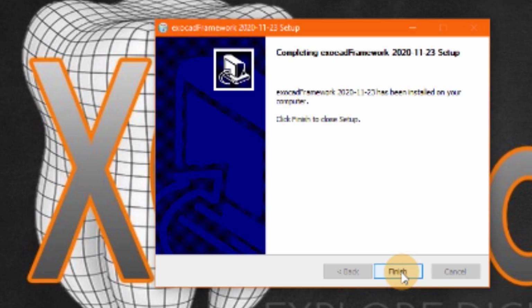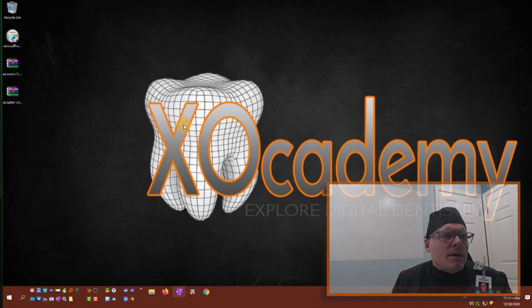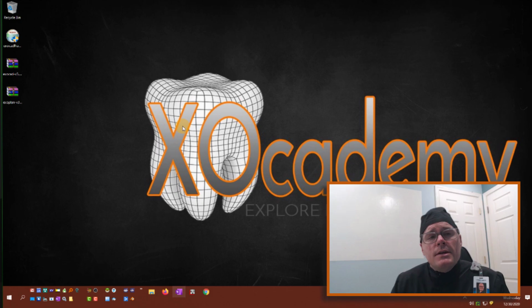Okay, finish the setup, and I think because I've already installed this, I don't have to restart my computer, but once it's installed, you may want to do a system restart just to make sure that all of the drivers are loaded on your system.